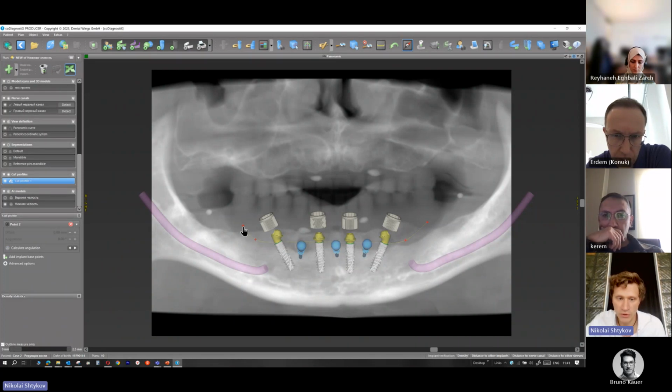You need to make this line smooth. And the future guide will be placed under this line. That's why you need to place this line. This line doesn't need to cross the sleeves, but it will be possible to be close to these sleeves. I think it's okay.